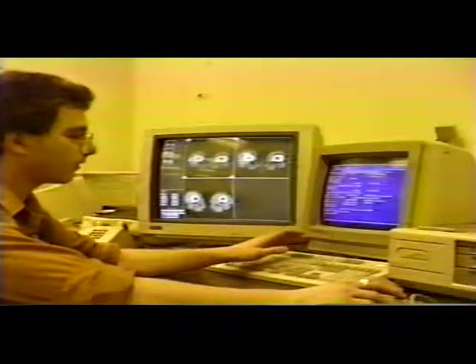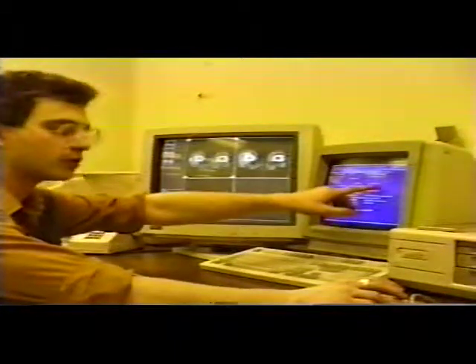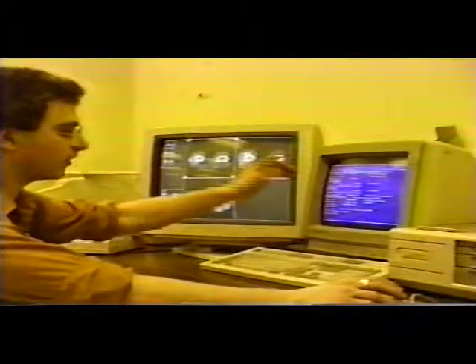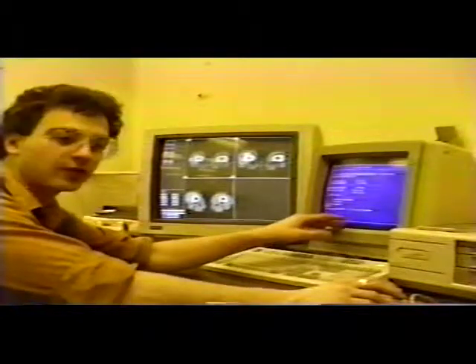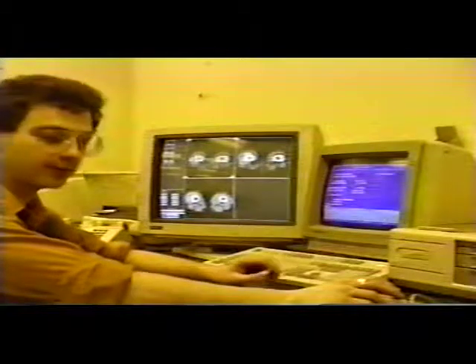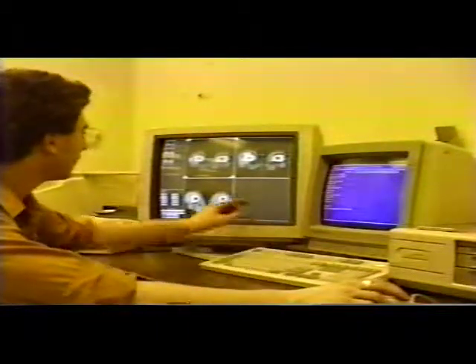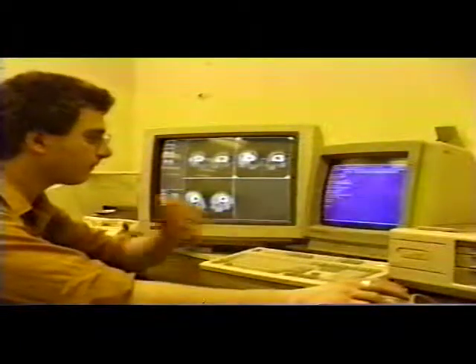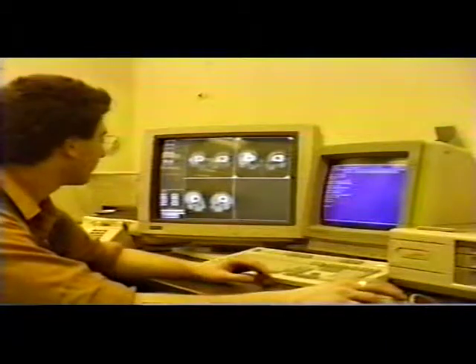We also store acquisition information, when the study was acquired, the total dose that the person received, the thickness of each slice, or the software version of the program. There's also patient information that's stored on the card, the name and address of the patient, and again, comments up to 8 pages long. If we're looking at image identification info, this is for image 5. We want to see image 2, just click on it, and now it's image 2. And that is transfer time from the optical disc.